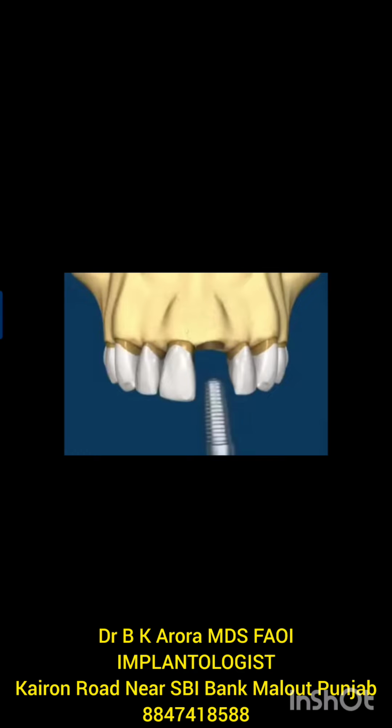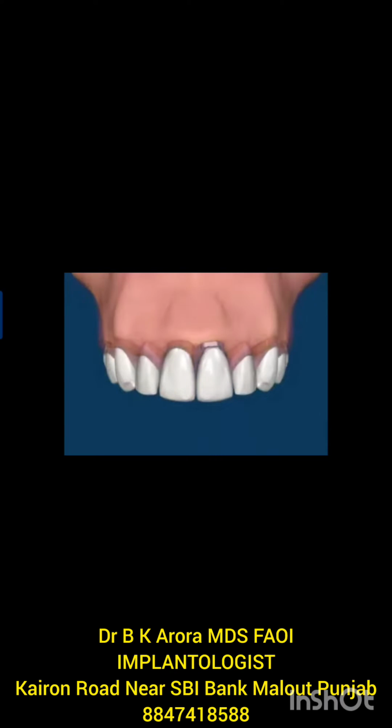The animation on the right shows the implant option. Here we have an immediate implant placement followed by the post and core, which is secured to the implant fixture, followed by a crown. In this situation, we do not involve the adjacent teeth.